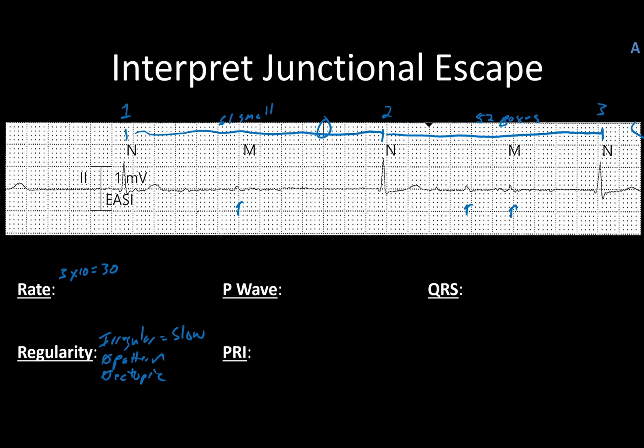And to work those out, just to give you an idea, doesn't matter how you cut it, that's a slow heart rhythm, period.